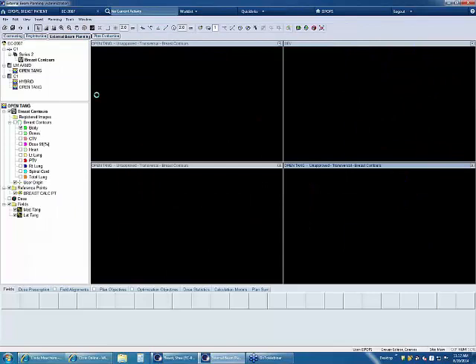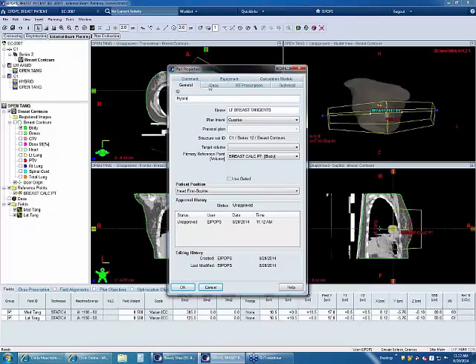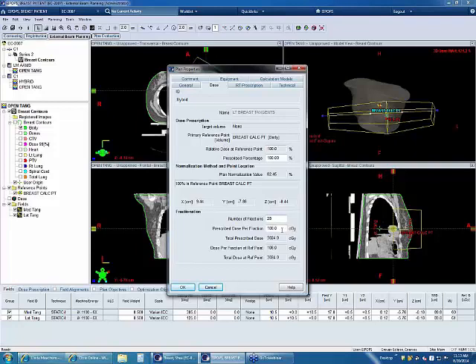And of course, if you have a tumor bed in there, you can make a CTV and ask for a little bit more dose in that as well. So I've already got my calculated plan. What I'm going to do now is just copy this plan, come back up here to these open tangents, right-click, and say Copy Plan, and I'm going to paste. I want to get all my fields in one plan. So this is my hybrid. And for the dose this time, I want the full dose. I want the 180 for 28 fractions, and say OK.